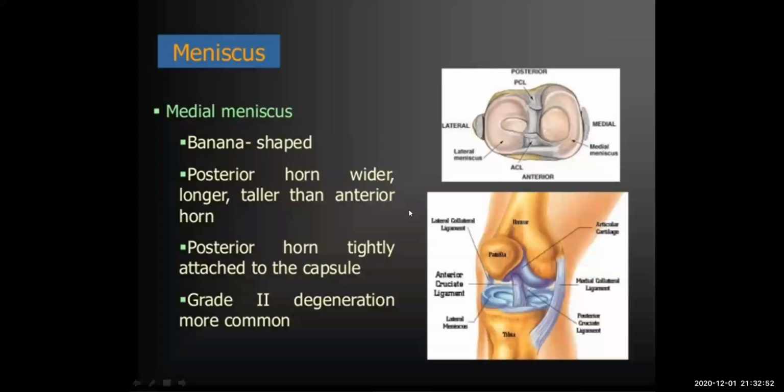Because it is based on the anatomy, as I told you, in T1, then I'm going to diagnose whether this meniscus is normal or whether this ACL is normal or not.